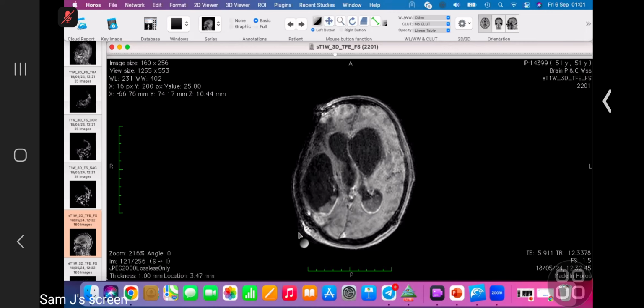So what will you assess next? How will you take this case forward? What will you do next? I will urgently contact the treating physician to check the patient's condition. If the patient presented acutely with fever and has signs of infection, and meningism maybe, my top differential would be ventriculitis.